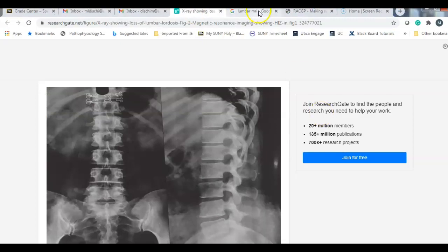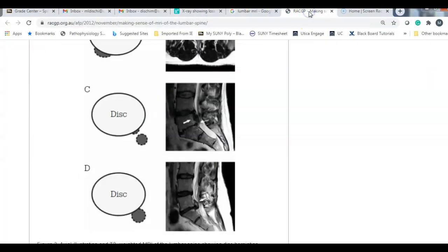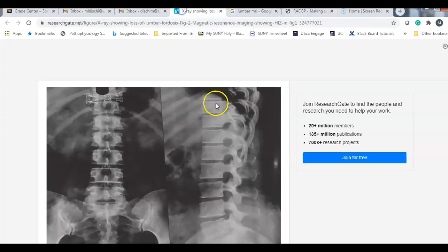So this is going into the lumbar spine now. Okay. This is very straight. Just so you know, it's part of the reason why I pulled this one up. So if we look at ABCs, alignment, you're supposed to have a nice lumbar curve. She has a very straight curve, or he. And then you should see it curving back.